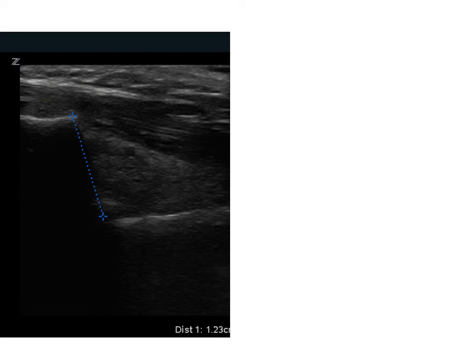Is there a fracture? Well, yes, there is. I realize there's the caliper sign showing how far apart the parts of the bone are, but even without that, we can see that there is a disruption in the normally smooth line of the bony cortex. So next part of the question.